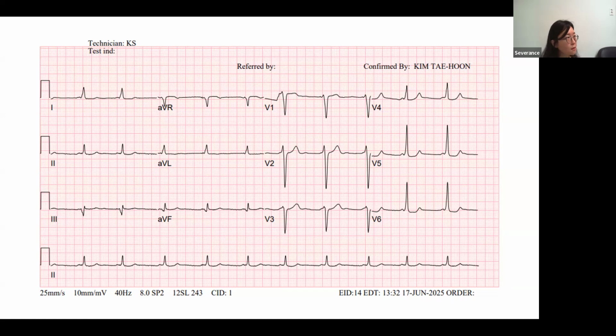Okay, are you with me? Yes. Okay, from lead 3, aVF and lead 2, that is a sequence of negative delta waves coming from the middle septum, posterior, the coronary sinus MCV area. If it is an anterior septal bypass tract, all leads 1, 2, 3 show a positive delta.